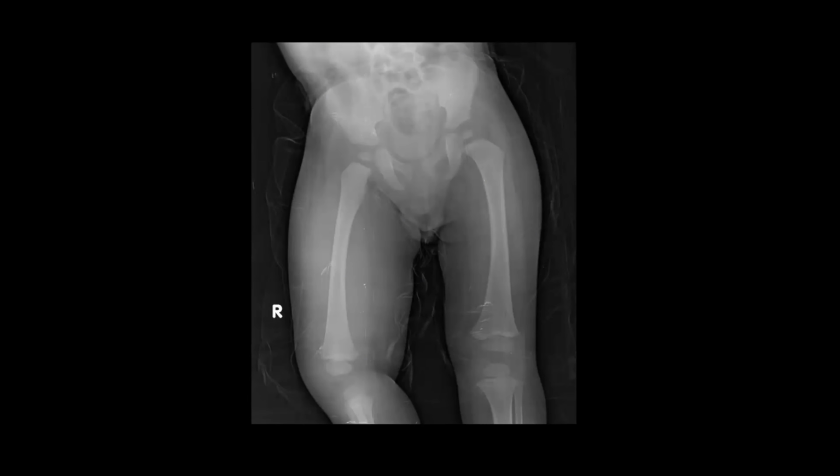Okay, so tell me one thing. If an X-ray is presented to you like this one, except bones, what are you going to look at? Except bones, I would look at the soft tissues. I would look at the bowel, I would look at the hernial orifices. Have you compared the soft tissues on both sides in this case? Any difference, or are they the same?